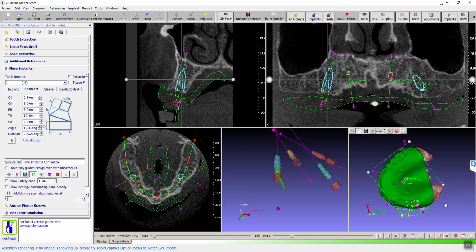Yeah, we're also choosing angles based on the two fixed multi-units we have. We have a 17-degree multi-unit, and we're not making custom multi-units. This is just a little detour, right? See here, after I adjust, it becomes 18 degrees. So this gives you a better position so that you can use a 17-degree multi-unit abutment. Yeah, it's helping you decide, but I'm saying we want to know it's based on the teeth, the guide. Right, absolutely.